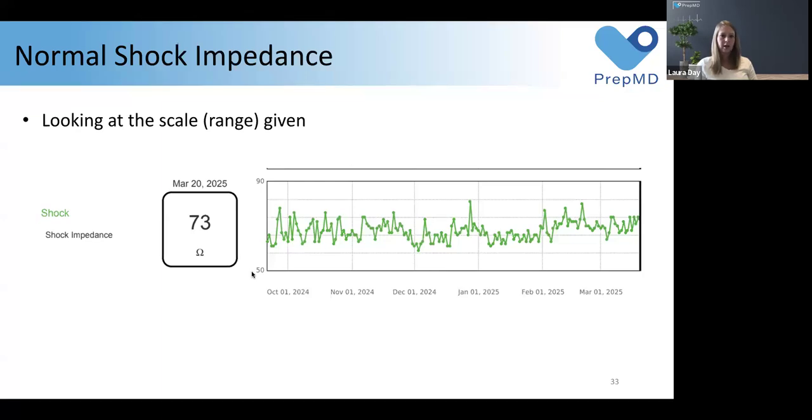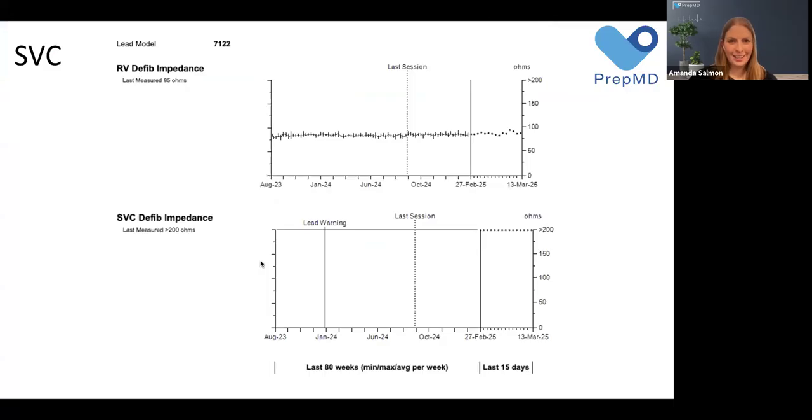And as we look at the next slide that Alan's going to go over for us, this is pretty much a straight line across. Even though when you zoom in, it might look alarming, being able to recognize the range that we have given can definitely put it into perspective and show that this is a stable trend. Yeah, definitely. I love the orient yourself to what you're looking at.